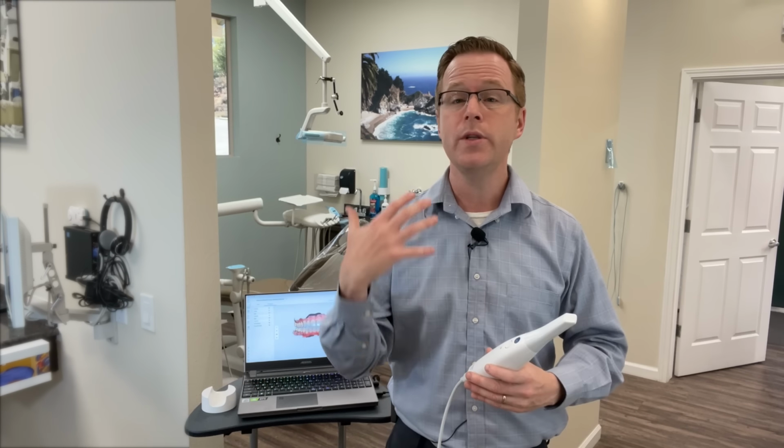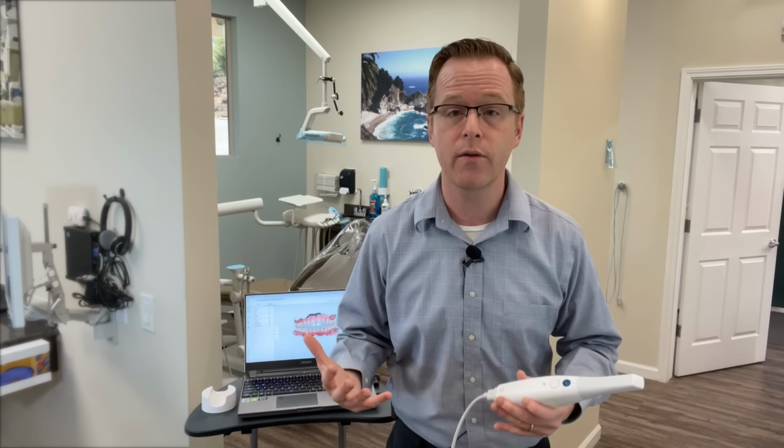And many times those creative ways are going to be able to produce quick study models or opposing models for a part of restorative dentistry or clear aligner models that my better half, Dr. Melissa Chotel, would use on her orthodontic side. To be able to take our models directly from the intraoral scanner to our 3D printer is oftentimes a little bit of a challenging clinical situation.